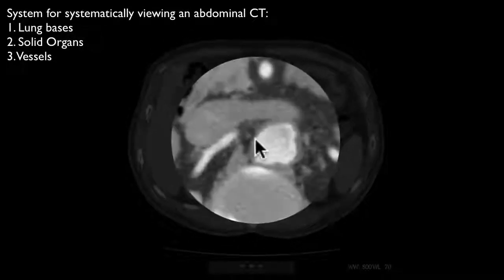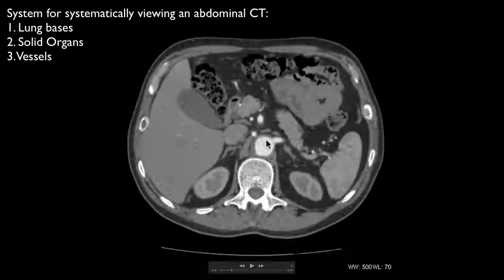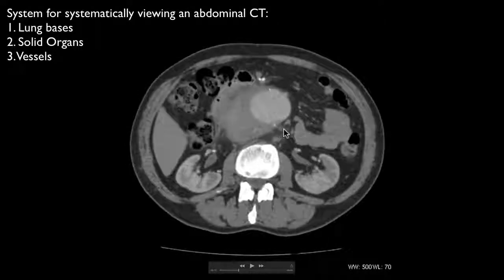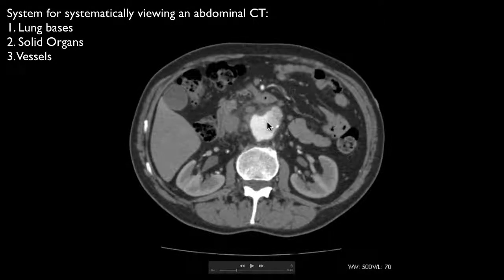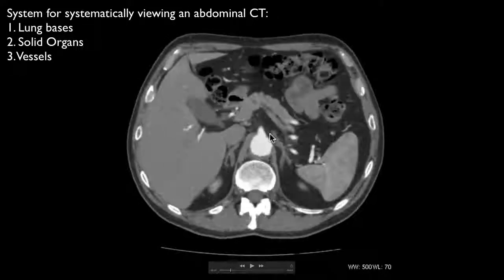Yeah, that's right. And they are slightly variable in where the renal arteries come off from. They don't always come off at right angles at the side there. There's often accessory renal arteries. I don't think there is an accessory in this case, but they're always worth looking for, and also important if you're planning some sort of intervention for this kind of thing.